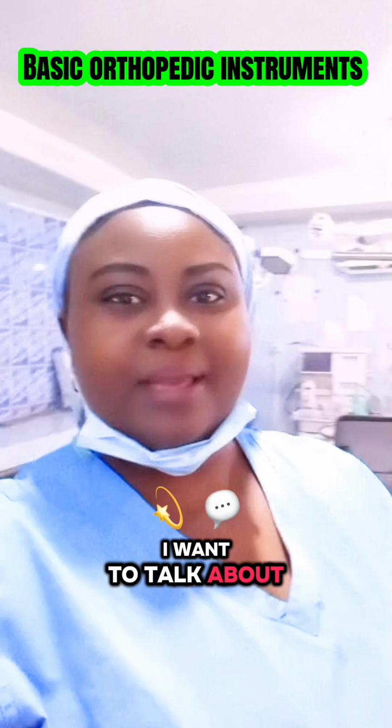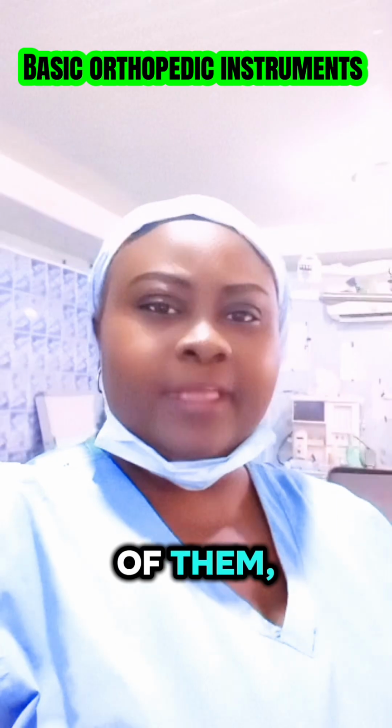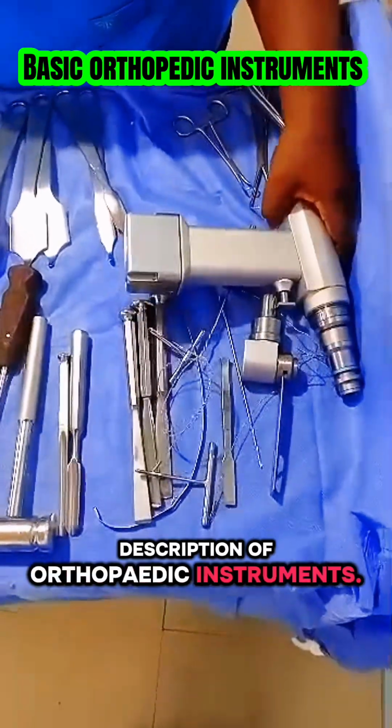I want to talk about orthopedic instruments, basic ones, not all of them, that you need to know. Let's delve into them. Description of orthopedic instruments.